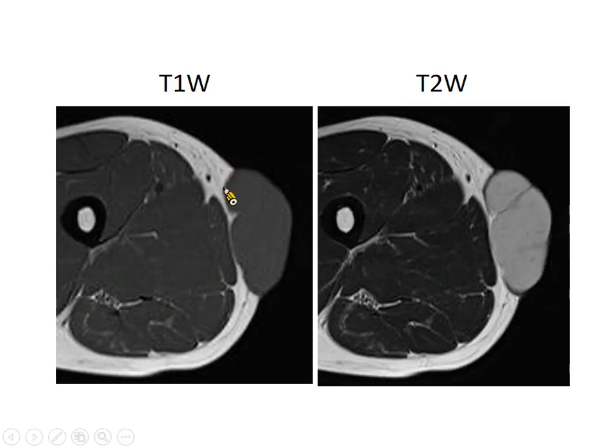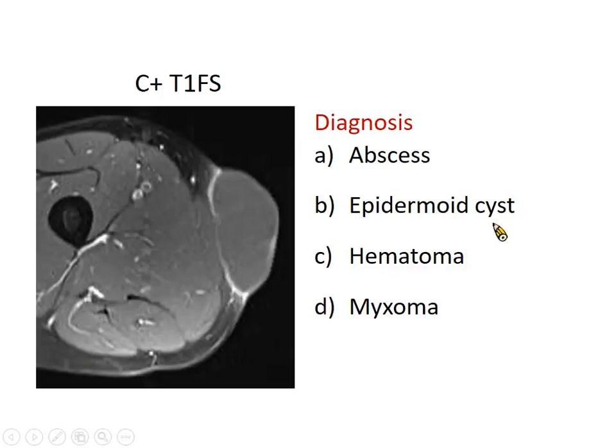Clearly, we can identify the separation by the fat, and there is a well-demarcated lobulated lesion over here. On T2, it is purely hyperintense with septation. The septum is thin, without any focal thickening, mural nodule, or soft tissue mass. After gadolinium, the patient didn't have any trauma. We can see the wall of the lesion is slightly enhanced and very separable from the muscle here, right?